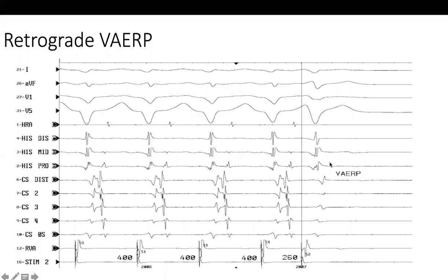We don't know which one is which. It's through which structure. I know that somebody will say, well, this is through the accessory pathway. But the AV node may still be working at this time. Yes, maybe still, but it is hidden by the activity of the accessory pathway. So when you block the retrograde conduction here, in the presence of accessory pathway conduction, we don't know which one is really there. Maybe the patient doesn't have VA conduction at all, but it was hidden by the conduction of the accessory pathway. Yes. Good. Any question about this slide?